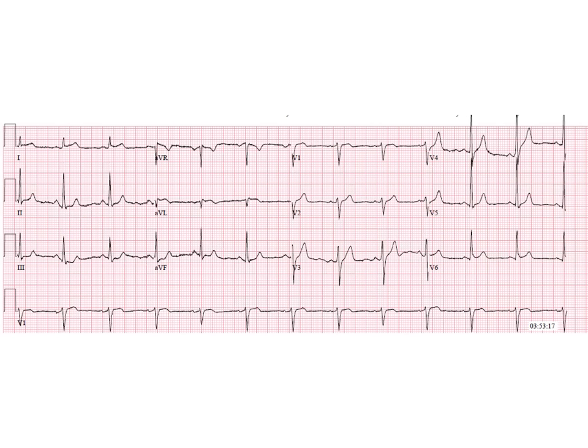The reason that I bring that up is because a lot of medical students look at V1, V2, V3, V4, and they're like, wait, is this a STEMI? Is this an ST segment elevation myocardial infarction? But it should go up from V1 to V4. So this is normal. Stare at it, get comfy with it.